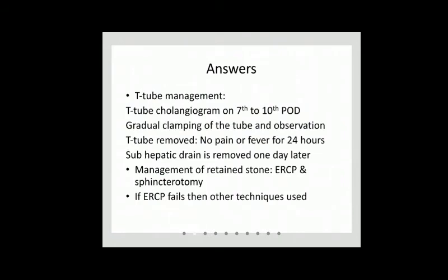What else? CBD stone, worm, then benign stricture. And another important one is the young female patient with a choledochal cyst.